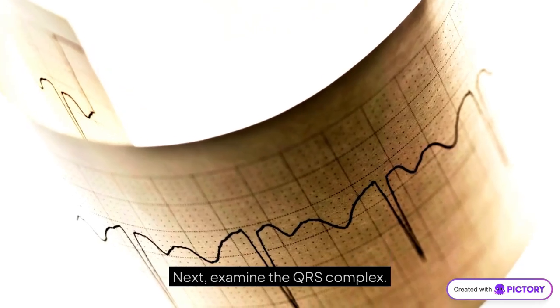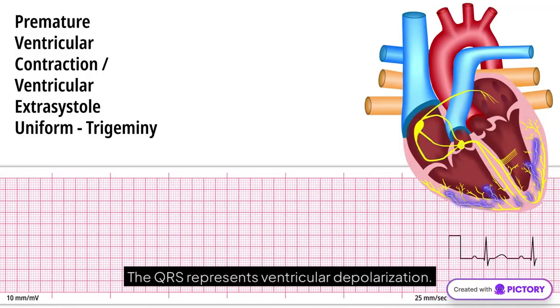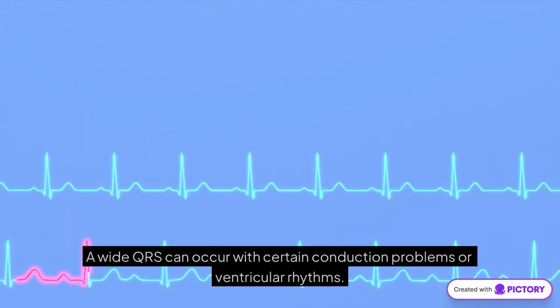4. QRS complex. Next, examine the QRS complex. The QRS represents ventricular depolarization. Normally, it's less than 0.12 seconds, or 3 small boxes. A wide QRS can occur with certain conduction problems or ventricular rhythms.